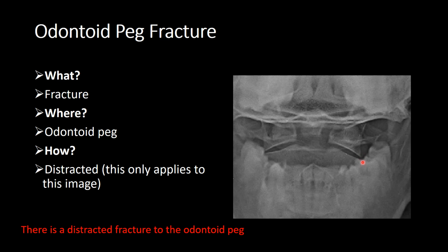It's not clearly demonstrating the lateral alignment of the lateral masses of C1 with the lateral border of C2. So again, we could have done with making sure that this mouth was open wider to be able to visualize that. So in clinical practice, you would repeat this. We don't need to worry about S for soft tissues.